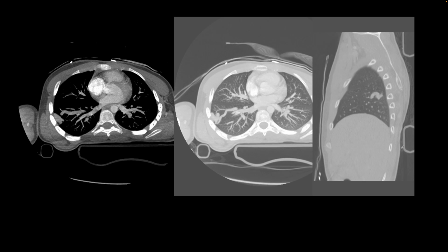This is our next patient, and we are looking at multiple images from their CT scan of the chest. This is the image showing the lung windows, and we have a curvilinear density in the peripheral aspect of the right lung, also seen here in the sagittal image. And on this thick or MIP image, we find that density is right here. It enhances when there is contrast in the vessels, suggesting this is an arteriovenous fistula.